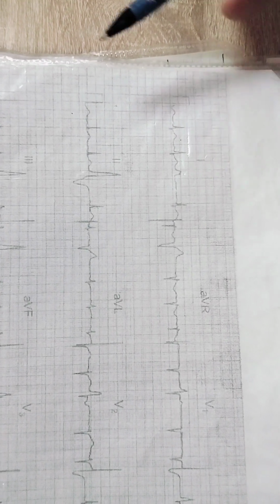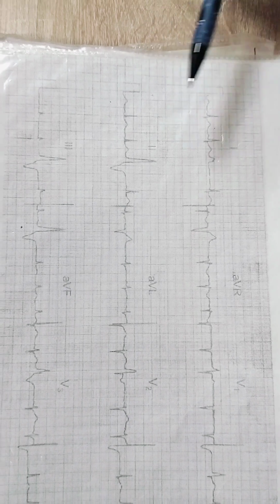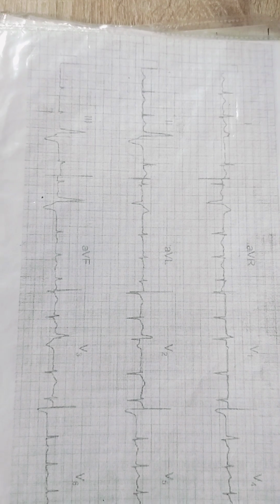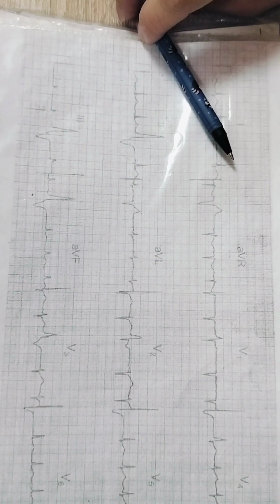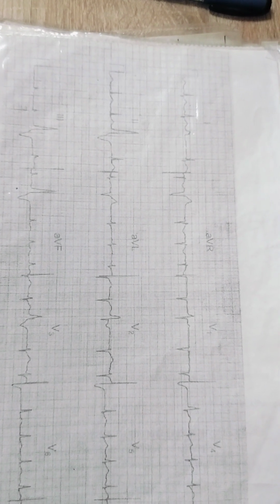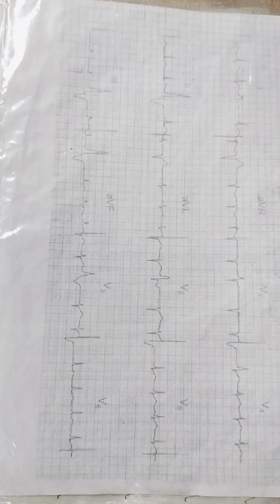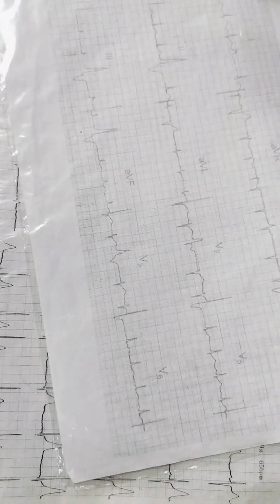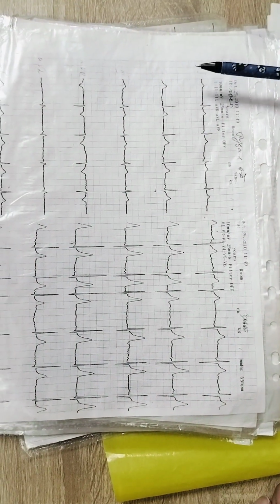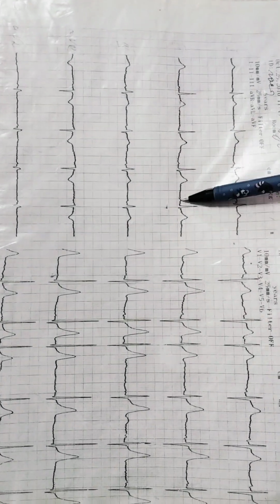4 plus 4, 8. Yeah, they are equal. That's why, for the electrical axis of the heart, if you conclude normal, it will not be a mistake. If you conclude shifted to the left, it's not a mistake too. Really, it is horizontal. But as for me, it's not so bad a mistake if you conclude it like normal or shifted to the left. In this place, P waves are small but present.